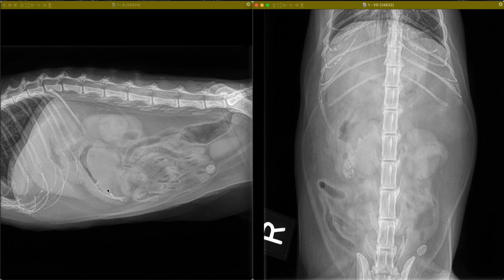These substantive changes in the intestine can certainly account for the patient's apathy and recent vomiting. So because of this, and the patient's age being relatively advanced, we are going to prioritize neoplasia. Our next steps would include tissue sampling. This can be performed with ultrasound guidance. The regional loss of contrast, like we had already discussed in our conclusions, could be regional inflammation. We could also sample some fluid and evaluate for fluid cytology.